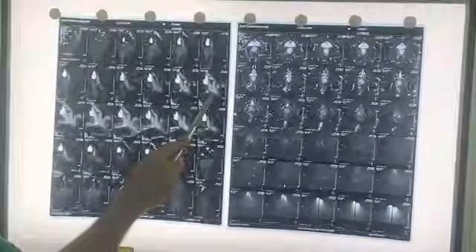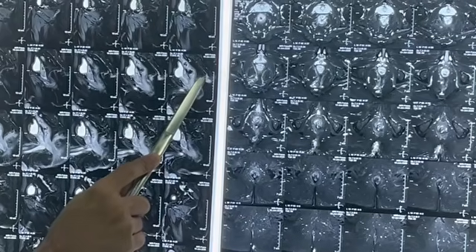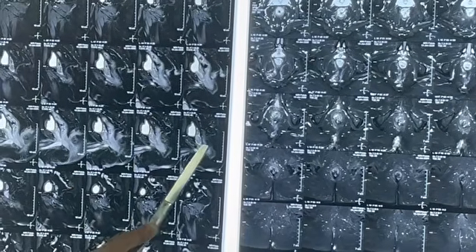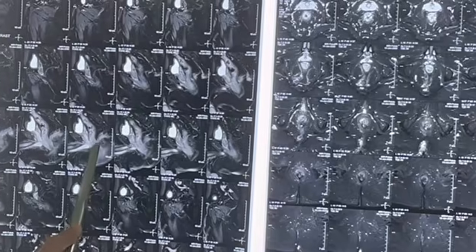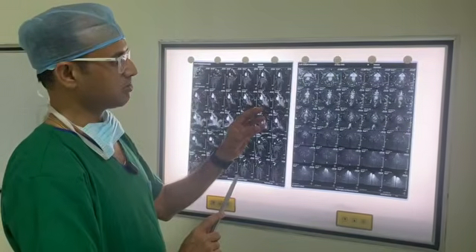This is the anal canal. This is the bladder, and this is the anal canal. This is the tip of the coccyx. It is going like this, sublevator in the deep postanal space, and connecting here into the coccygeal tip. This is the hyperintensity getting connected. So this is a classical presentation of a posterior high transsphincteric fistula.